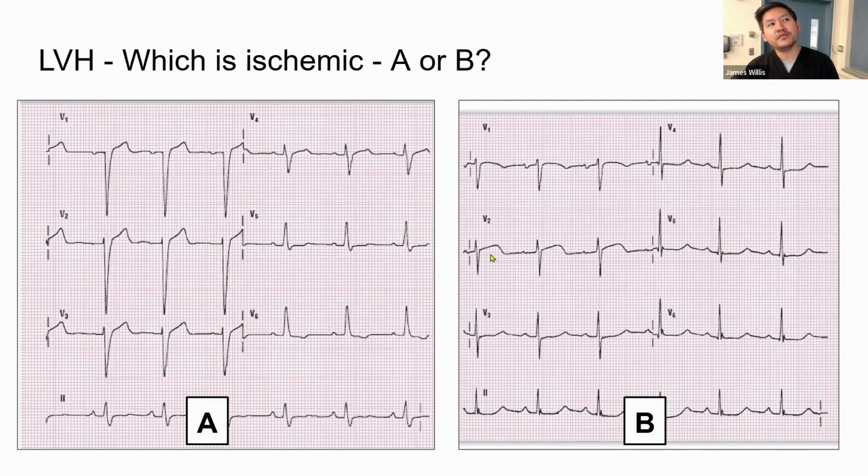There's a millimeter elevation in V2. I don't know. You don't have any information. The nurse just gives you the EKG. You're examining another patient. But this is probably someone I would get out and say, hey, maybe I should go see the patient.